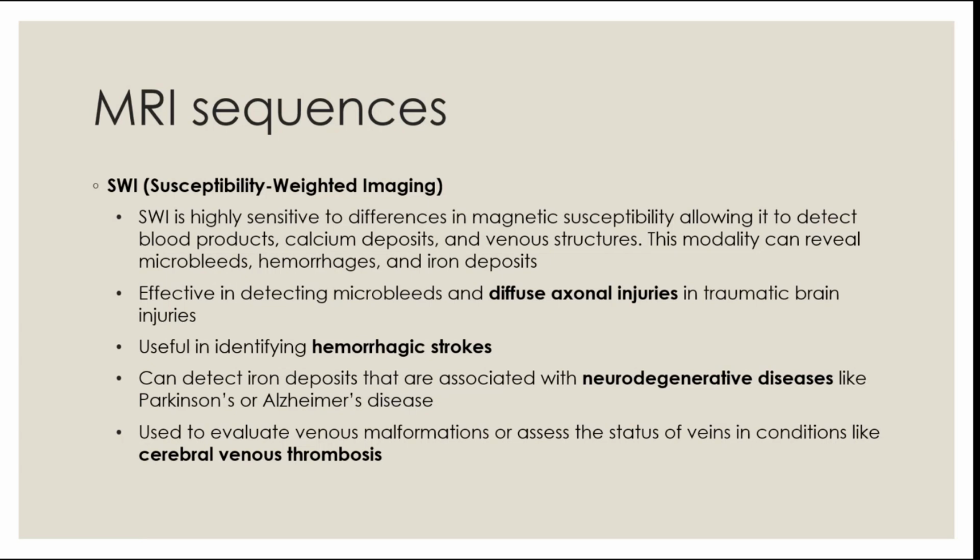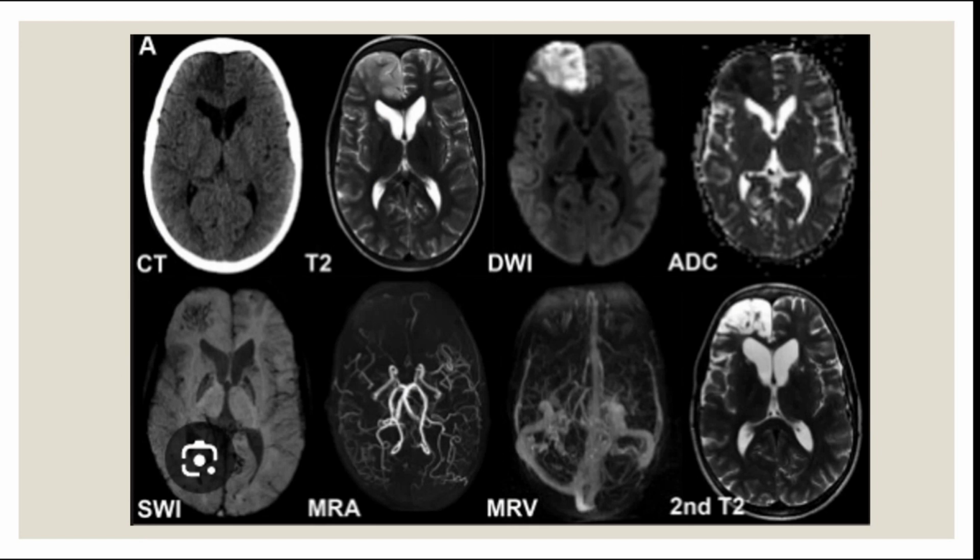Now, for all these sequences, you can mention them in your oral exam, but the most important two that you really need to distinguish and tell the difference between are T1 and T2 weighted sequences. So this is an image for all the different sequences. There are other sequences, but these are the most important.